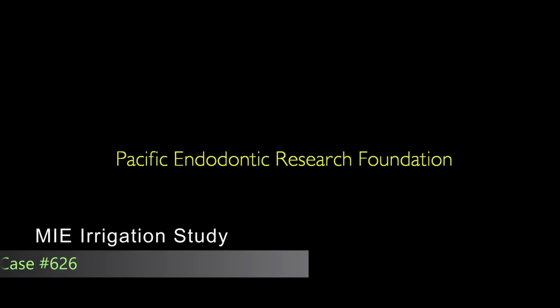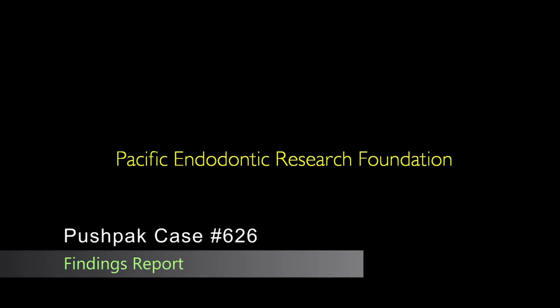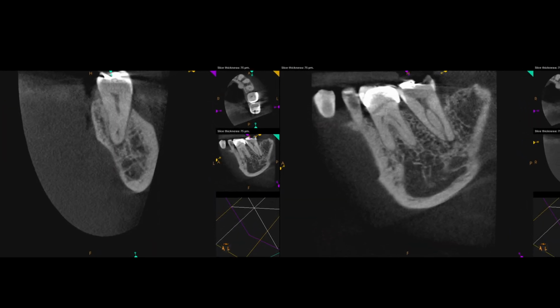This is our report of findings on Pushpak's case number 626. I'll review this quickly so you get a sense of how well the irrigation device performed and how you can refine your image interpretation. This is Pushpak's PA, and this is the CBCT he submitted with the case.